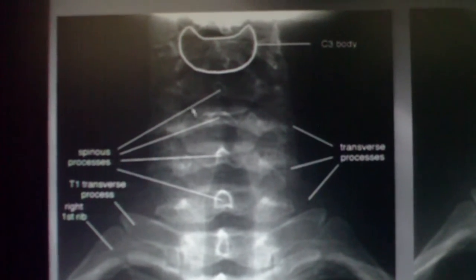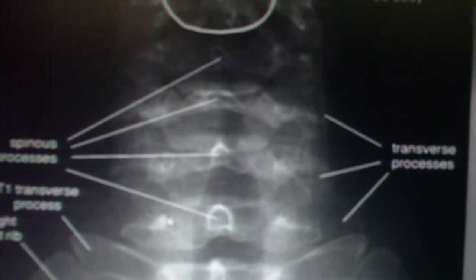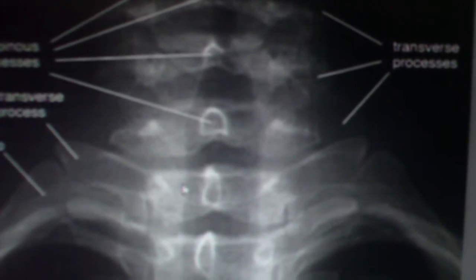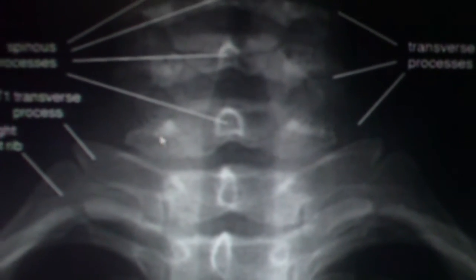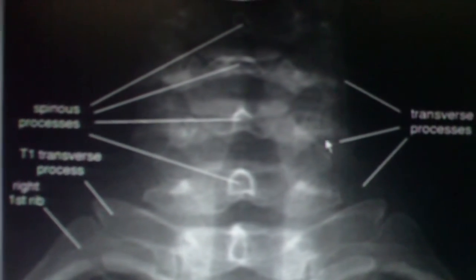Okay, these little bumps here were the uncinate processes. Most people got those in the quiz, right? These are the pedicles, right, which become nicely identified circles when you get into the thoracics and the lumbars. Here, sometimes they're obscure, but still look there for them.